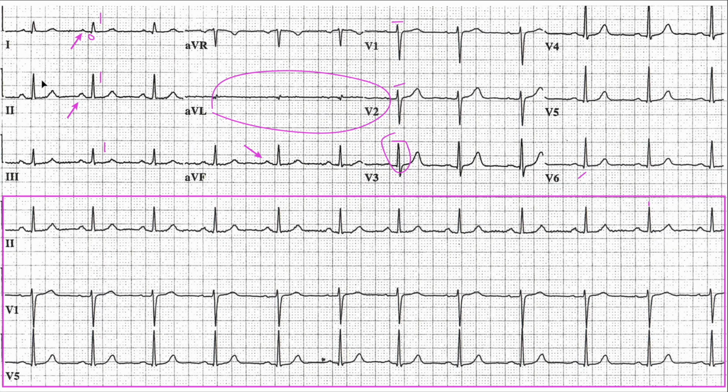So what do we have here? We have R wave progression that is early, and we have AVL that, if this is not a mechanical issue, if this is not an electrode, there could be some effusion, inflammation, or maybe even something worse. This needs to be brought to the physician's attention.